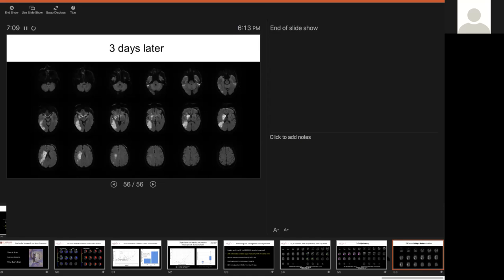So in the first hour, we use a different threshold. We don't use the 30%, we use a 20% threshold. So we tend to be extremely aggressive in the early hour. But on the other hand, if you see somebody at 4 or 5 hours, they have horrible CBF and CBV. So on the dark blue CBF, dark blue CBV, we have not seen good outcomes from those patients. We've tried recanalizing them. These are the patients that we see the highest hemorrhage rate. So it's this very malignant collateral pattern that's pretty uncommon. But when we see that, it does very poorly.